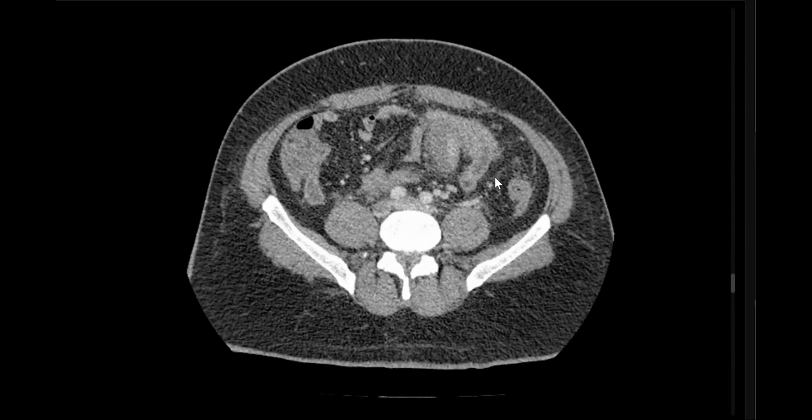So my final diagnosis would be a case of acute diverticulitis complicated by perforation. I'll urgently convey these findings to the referring physician of this patient and also the interventional radiology team, who would do ultrasound-guided or image-guided drainage for these collections. Good, my friend.